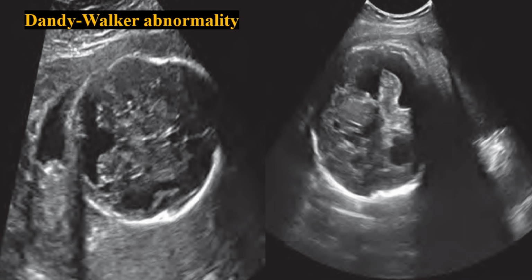Dandy-Walker malformation consists of cystic dilatation of the fourth ventricle, which communicates with a large fluid space in the posterior fossa through a defect in the cerebellar vermis. Here we can see the axial image of the fetal head at the level of the posterior fossa that shows a Dandy-Walker abnormality with the cystic dilatation of the fourth ventricle, which can be seen here, and it is communicating with the fluid space in the posterior fossa through a defect in the cerebellar vermis that is resulting in a splaying of the cerebellar hemispheres.